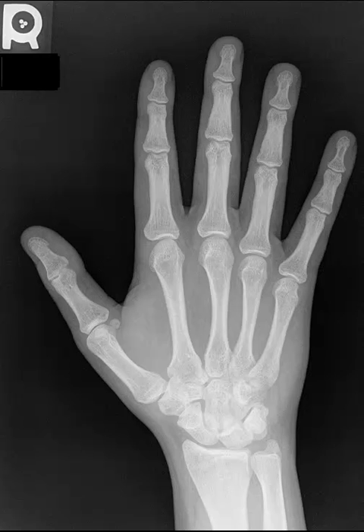Let's begin with some normal anatomy. Beginning in the wrist, this is the ulna. I'm just going to change my color here. I don't know how well black is going to show up. Here is the ulnar styloid. This is this stylus-like region, and again the rest of the ulna.